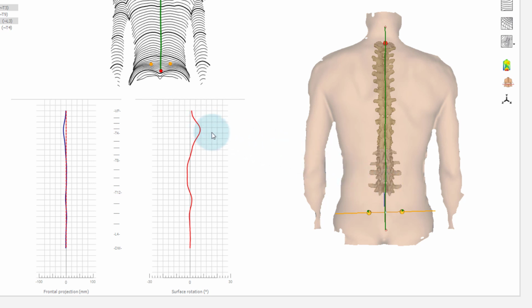However, the most important argument of the pelvic correction is the establishment of reproducibility. Via the zero position, every surface rotation, whether intra or inter-individual, is at the same starting point and thus offers the best comparability.